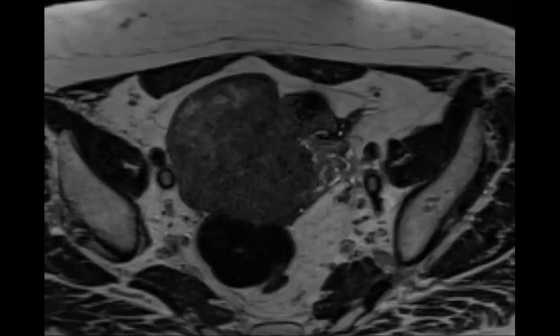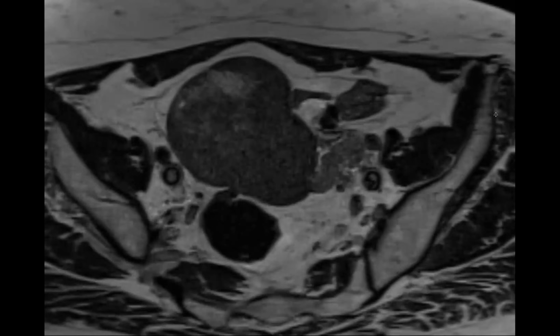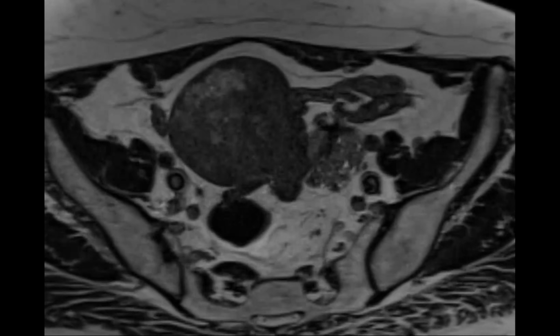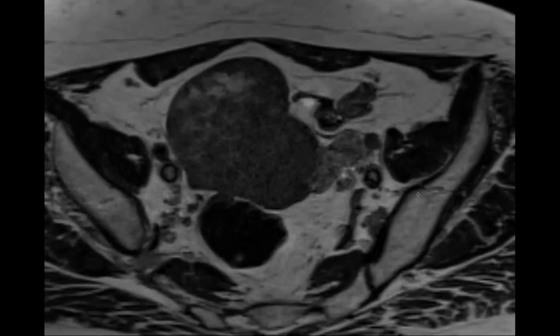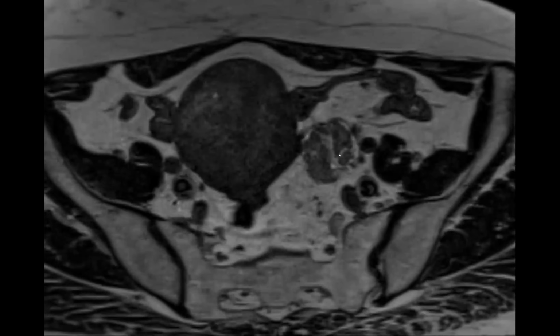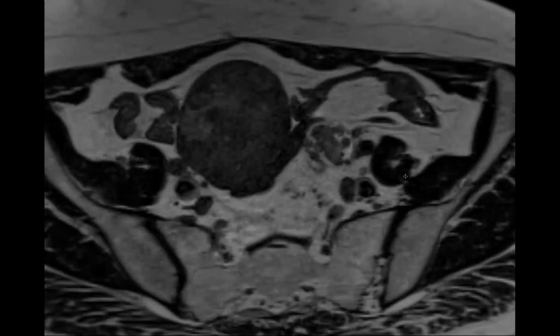And this is the high-res T2. Fallopian tube cancer? It's something adnexal. There's like the left adnexal, the vessels are dilated, so supplying that. So some left ovarian thing or fallopian tube thing. When we first looked at this, somebody was like, "Is this malignancy? Is that a fallopian tube cancer?" I briefly was like, "Is that a cotyledonoid fibroid?" Because it looked a little like little serpiginous things.